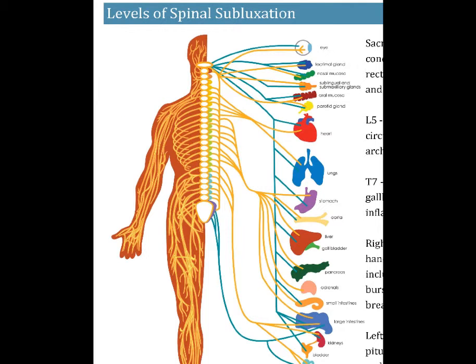The purpose is that if the person has a sacral issue on the right and into the left hip, you can mark that. This is your sacrum, all right? So that sacrum innervates this area. It sends messages down this side, and here's what that area goes to.